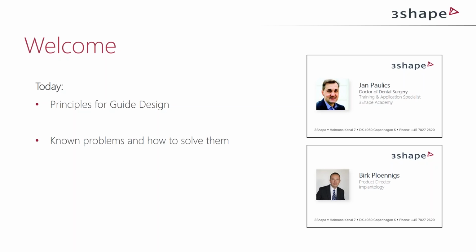We will also talk about some known problems that we know when we do guide design. Teeth not standing in the correct position, patients not looking as they should, and also how we can solve them as well.